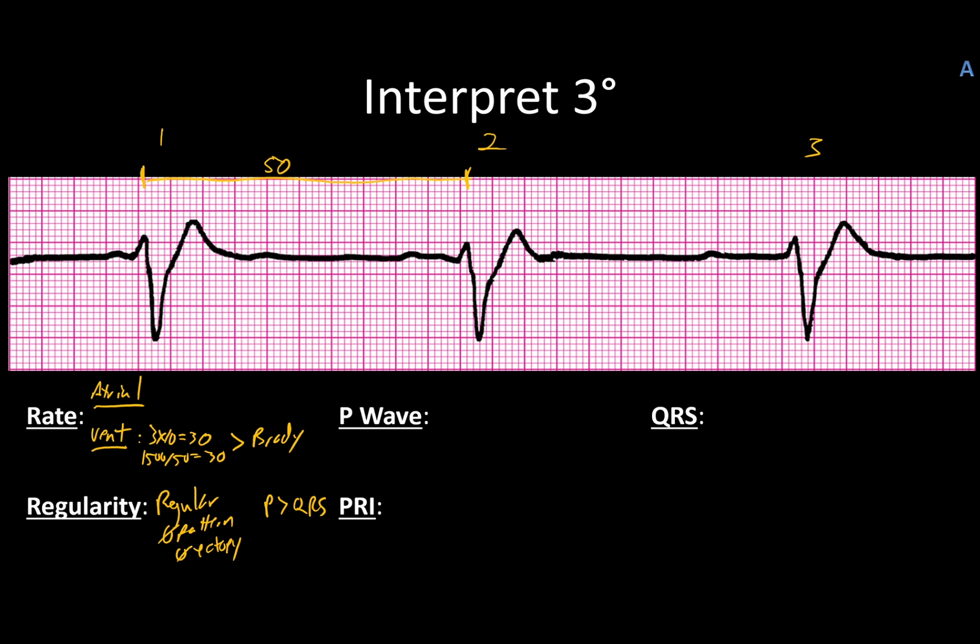In terms of looking at the atrial rhythm, this is the part where it actually gets quite challenging, and we're going to look at the P waves on this one. The most obvious one that you see is likely to be this one here, because it's right in front of a QRS. There's this one here that's a little further out, and then there's this one here that's further out yet, which is pretty cool.